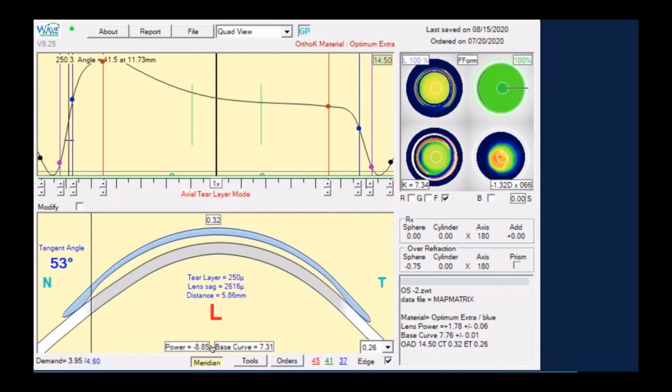But we've got some great controls to go in there and fix this. So if you look at the area, what you're going to do is look at the area between the pink dot and the blue dot. The pink dot is basically where the landing zone generally starts, and the blue dot is basically, as I called it before, the intermediate zone.